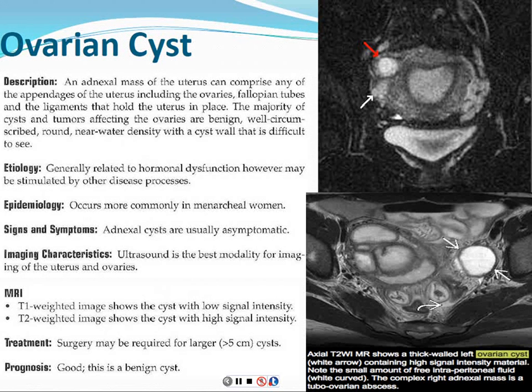Often, the early ovarian cancers look cystic, but they'll have those suspicious features, which is what we're looking for. So you'll probably be seeing some pelvic MRI to follow up a cyst that looked a little bit funny on ultrasound.